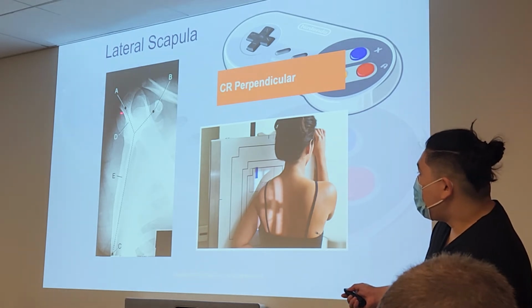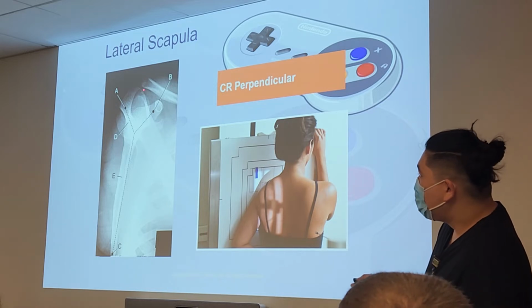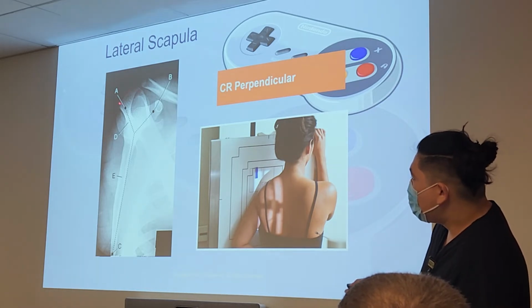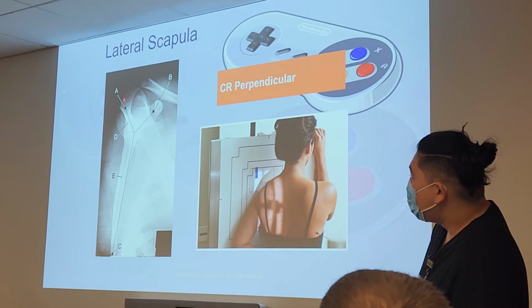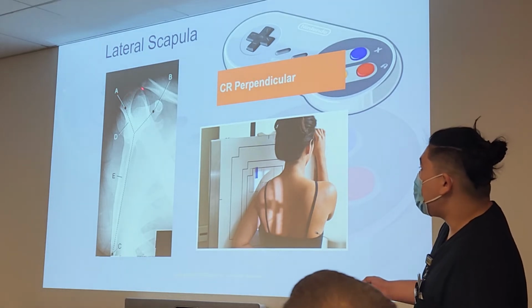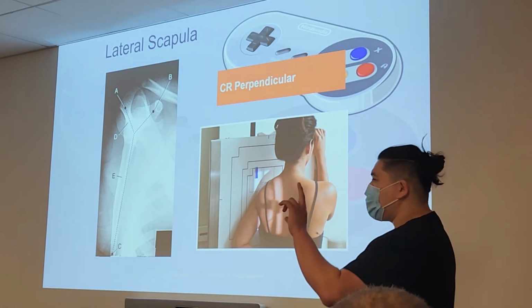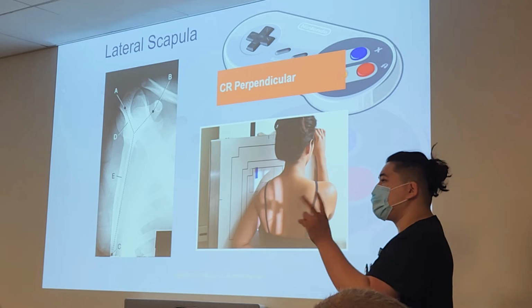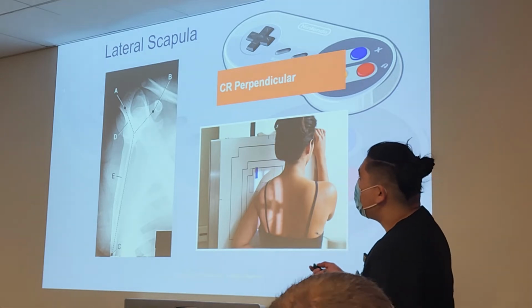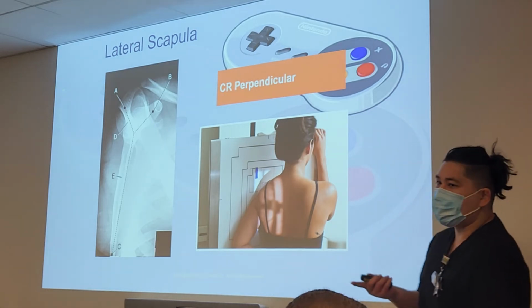We'll start with A. What do we have? I'm gonna say coracoid. No, it might be the acromion. It is gonna be the acromion. That is the acromion there because remember it's on this lateral. You have to kind of remember where they fall in here because the position's gonna switch up a little bit. But what about B? That would be the coracoid there.